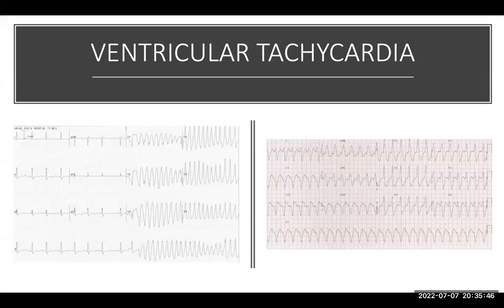There are different types of ventricular tachycardias. This is not the time to discuss it. The most important thing is, number 1, it's usually regular. The distance between this and this is constant, like that. Now, if the QRS complexes all look the same, we call it monomorphic ventricular tachycardia. If there are different shapes and types, I will show you, like in this case, for example, you call it polymorphic ventricular tachycardia. You must identify ventricular tachycardia because it can cause cardiac arrest.